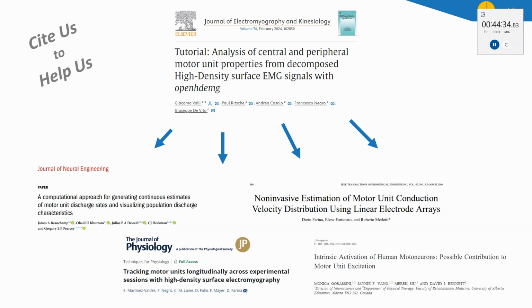One thing that I want to point out is that among all the measures you have seen today, some can be more sensitive to errors in the decomposition and some are less sensitive. Based on that, you need to judge the quality and decide which units you are going to use for this kind of analysis later on.